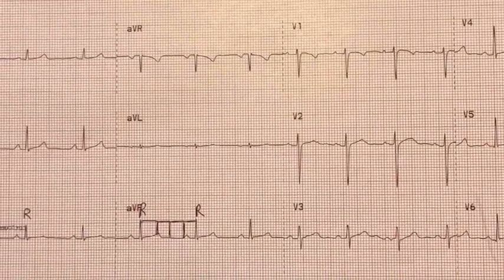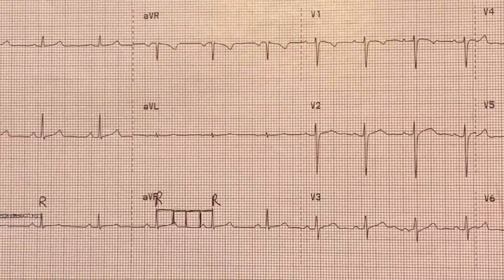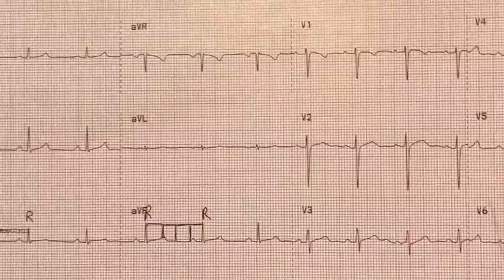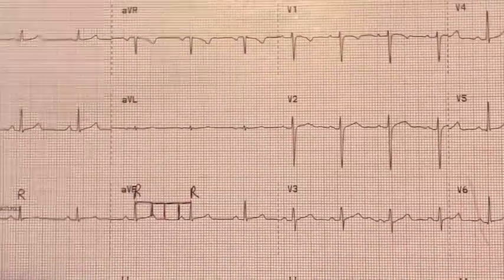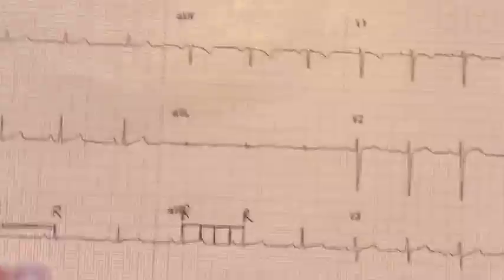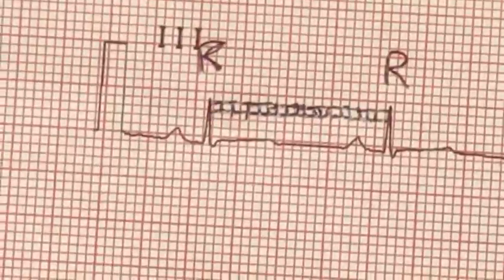I'm also going to be forwarding you guys a YouTube video that shows conduction of the heart, and it also goes over these steps as well, but I just wanted to work it out for you. So this first one, I'm going to have my daughter zoom in. I'm sorry if it's a little bit shaky, but we're doing the best we can.